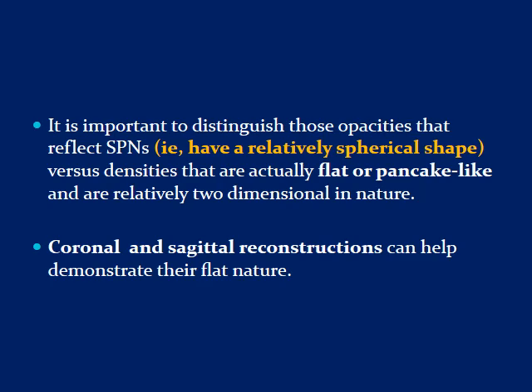It is important to distinguish those opacities that reflect solitary pulmonary nodules, which should be spherical in shape, from densities that are actually flat or pancake-like, using the two-dimensional views, that's to say in the coronal and axial, or sagittal and axial, and so on.